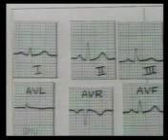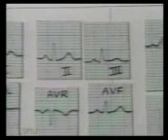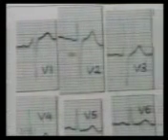Next, we come to the ST segment. If the ST segment is elevated or depressed, the pattern must be studied and clinically correlated to myocardial infarction, myocardial ischemia, pericarditis, and ventricular strain patterns.